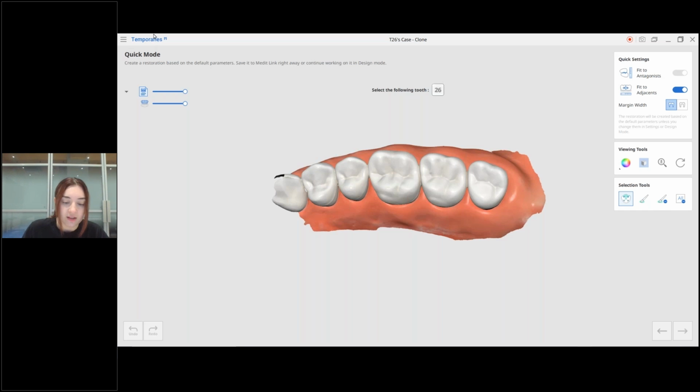But in this case, our philosophy behind this app is to make sure that you can actually create a crown in 2 or 3 clicks. So that's why we try to minimize the user interface as well, so you don't have to put your attention to anything other than the crown that you're making. I love how simplified you guys have made this, and how simple it is on the screen. You've taken the noise out a little bit, so it makes the process look extremely easy. Yes, that was the whole idea behind it.